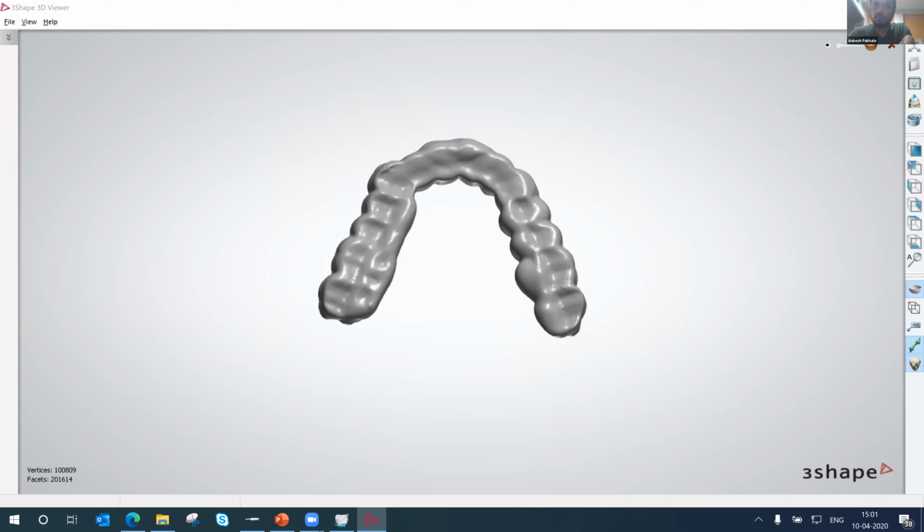So if you record with the jig at open vertical in the mouth, is the open-to-splint minimum thickness left at 0 mm? Gordon, you have asked this. Yes, I would keep it as 0, because our opening has already been done inside the mouth. So we don't need to open it over here, because we already have those openings.